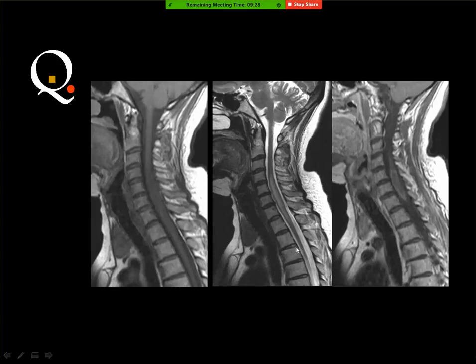And you remember in the lecture that ependymoma is characterized by hemorrhage, and this is one of the important diagnostic signs. But if you see a longitudinal abnormal signal within the spinal cord, then the diagnosis is transverse myelitis. And transverse myelitis can sometimes enhance. Then transverse myelitis is not a diagnosis. It is just a description for differential diagnosis.